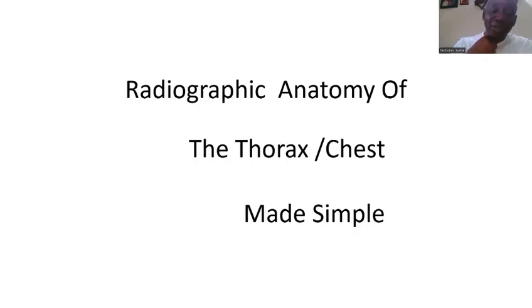Chest X-ray is the most widely requested radiological investigation worldwide. So there's hardly any time that you will not find a test on chest radiograph. Also, chest made simple. We're just going to go to the basics.